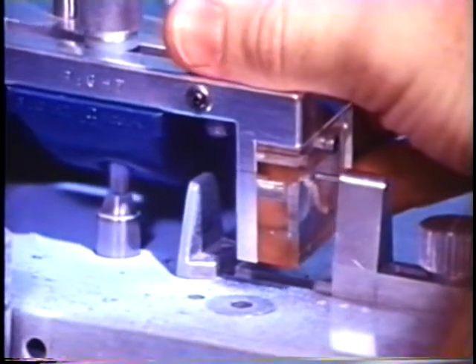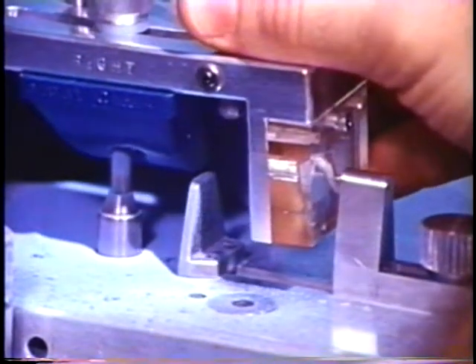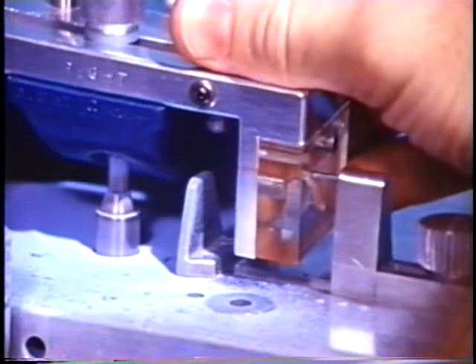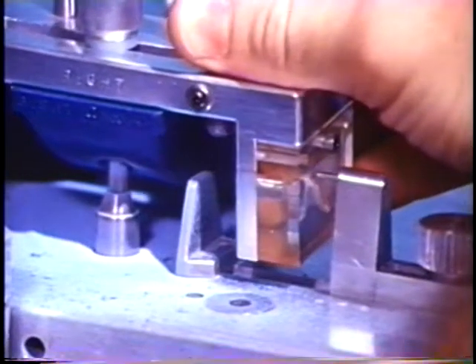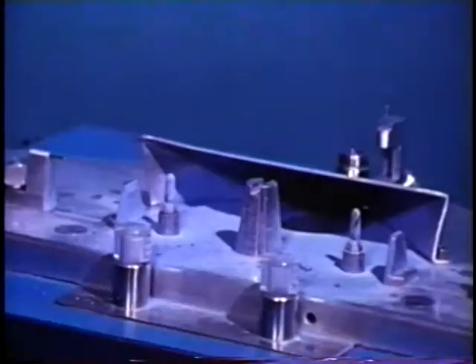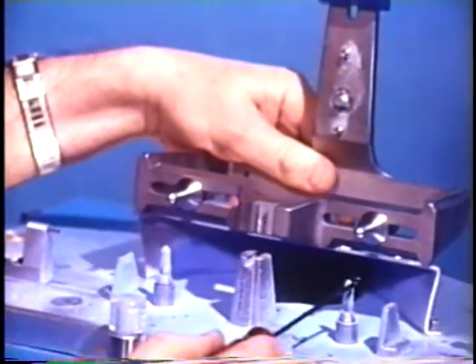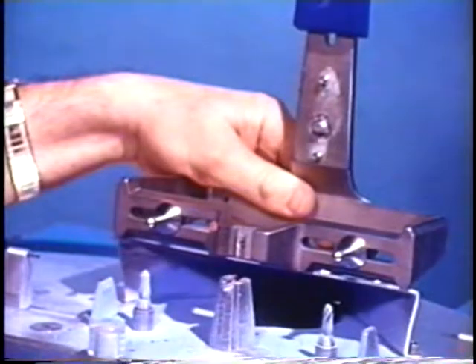The patient's lateral movement recordings are now being milled. This particular patient is one that had excessive lateral translation or Bennett movement. The 1/4-inch condylar spheres of the articulator match the rounded ends of the milling drills.